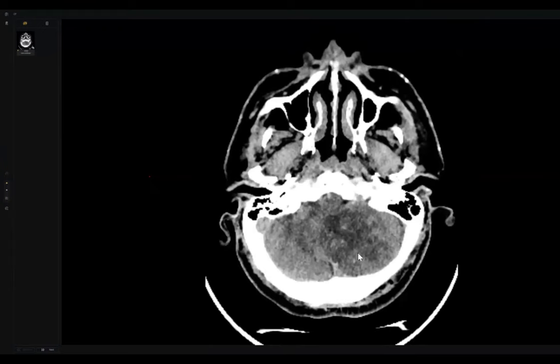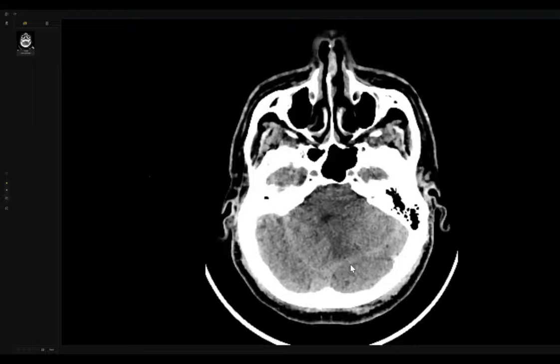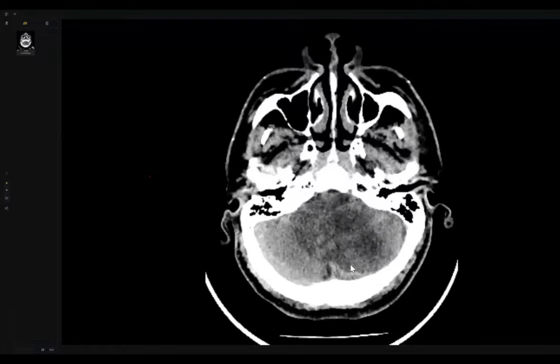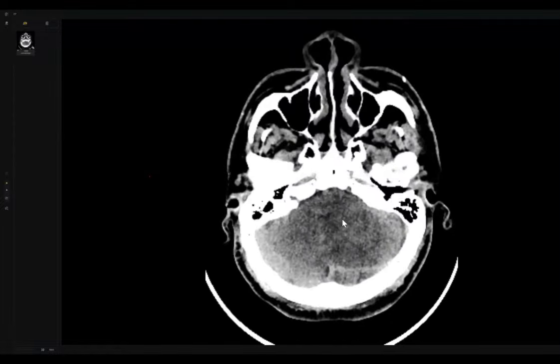Even here, if you look, the cortex is good, just subcortical or subfoliar. So it is more than 80% a space occupying lesion. And second thing, the examiner made it more difficult when he hid the actual history of this patient from our colleague: acute and sudden loss of consciousness.